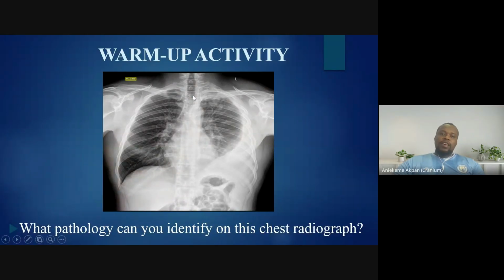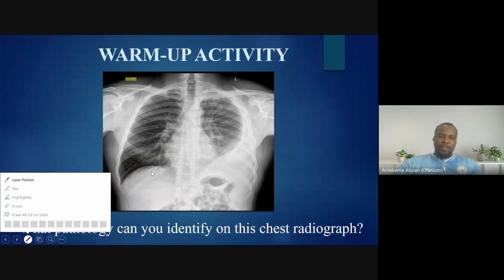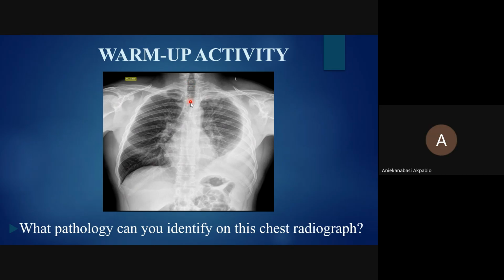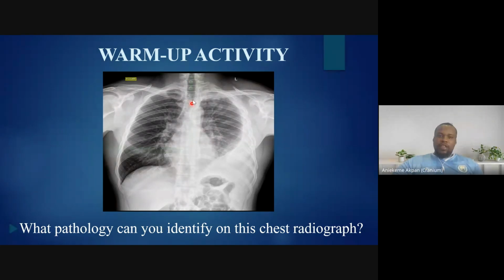But you know what the A and the B is all about. So if we are looking at the airways now, starting from A, you are looking at the trachea, and of course, you get to the carina of the trachea. Can you guys see the pointer? Yes. All right, so you can see this is the trachea, and this is the carina of the trachea, and this is the right bronchus, and this is the left bronchus.